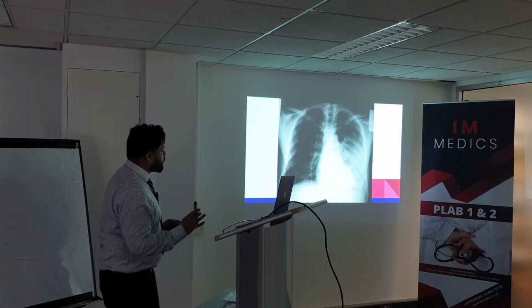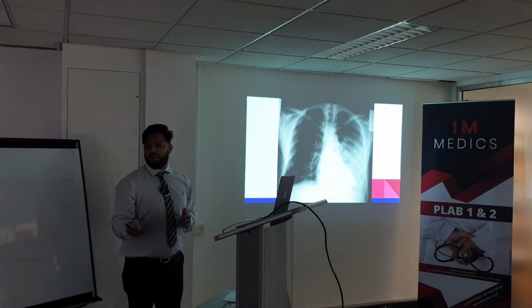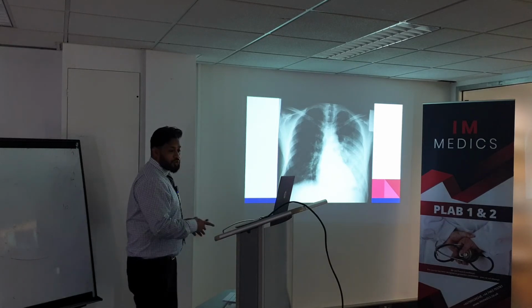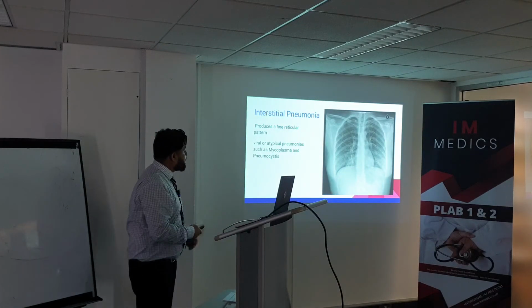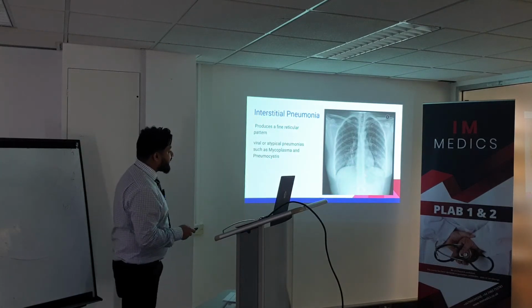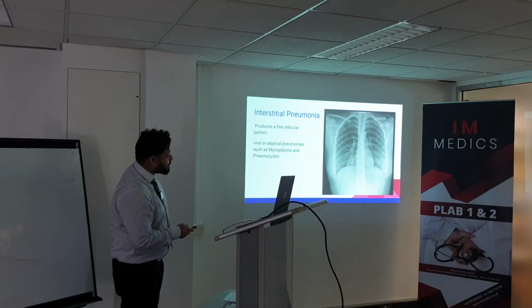Okay, so a few things, yeah? To find out, some people said pneumothorax, some people said pneumonia, everything, yeah? So let's find a pneumonia. Okay, let's use this one. Pneumonia, can you see these angles? Are they clear? Can you see them? Yes. Can you see this angle? It's a little bit fluffy here, isn't it? So there is some kind of thing going on.